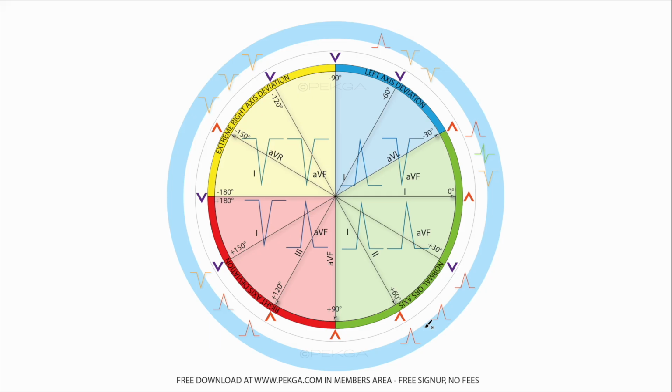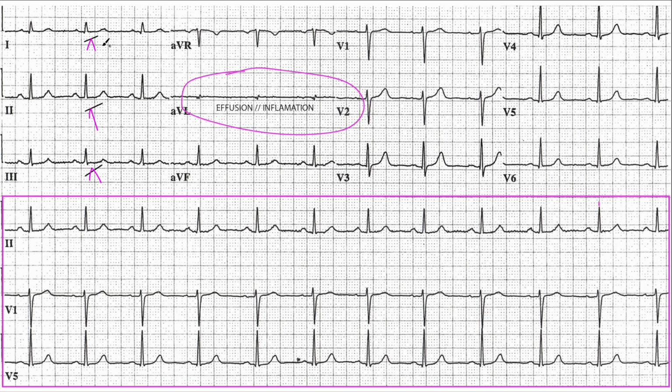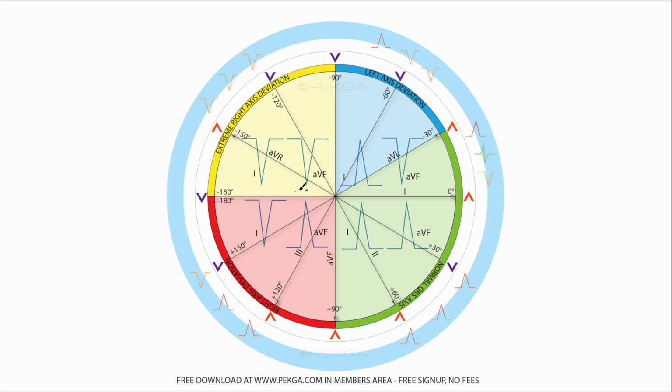So the overall propagation of signal appears to be absolutely normal. You can also use the quick method, and that's using lead 1 and AVF, and you want to see if this is upright, that's upright. When I say upright, I mean the QRS, right? So the QRS is predominantly positive in both of these, and you have it here in the quadrant, right?